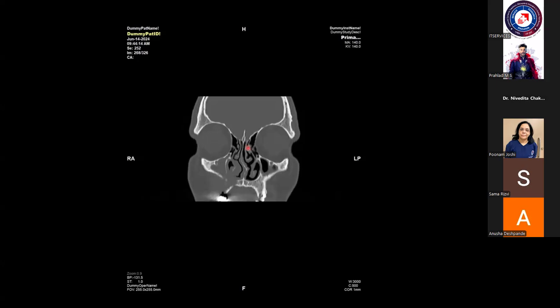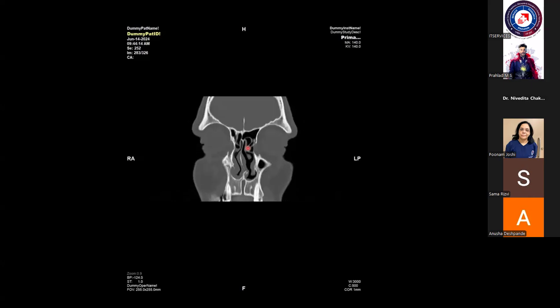So another question, pterygopalatine fossa, what would you suggest, CT or MR? Which is better? It's complementary. Initially you can see on CT scan the indirect signs, as I said, widening of foramina. But for actually visualizing the superior communications, it is MRI. As long as it is at the skull base level, it will be CT scan. But when we want to see the communications through foramen rotundum, inferior and superior orbital fissure, then that will be MRI. That will give a better idea.